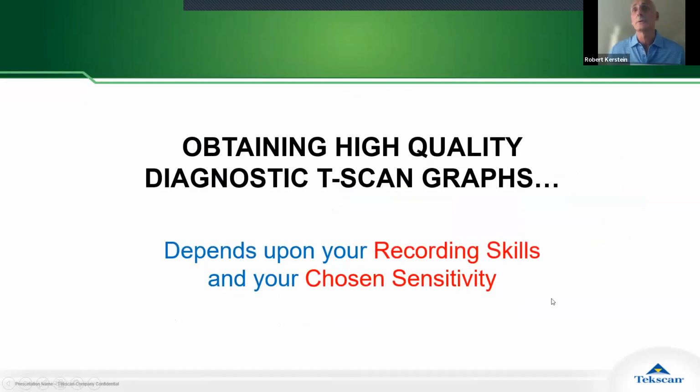It's very important that you understand obtaining high quality diagnostic TScan graphs depends on two things. It depends on your ability to record patient functional movements, which is a skill in itself that involves coaching the patient, viewing the screen, and observing the data as it's being recorded live. And the second, and even if not more important, is choosing the right level of recording sensitivity, because the recording sensitivity dramatically influences the graph.